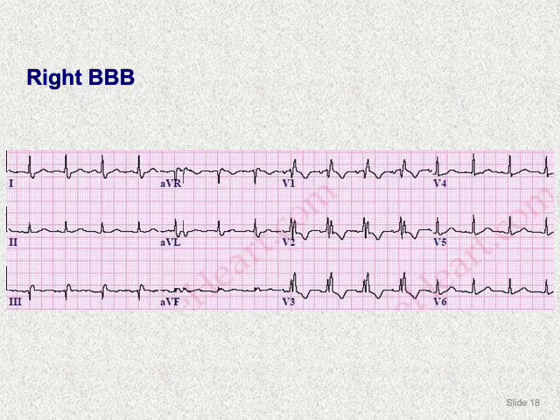In this example, again, this is sinus rhythm. Rate is around 100 or a little bit less than 100. So this is normal sinus rhythm, and the axis actually is normal, this is up, and this is up. And the second thing is QRS duration. We see here the QRS duration is wide, around 3 mm, and this is an M-shaped pattern, and it's more obvious here, of course.